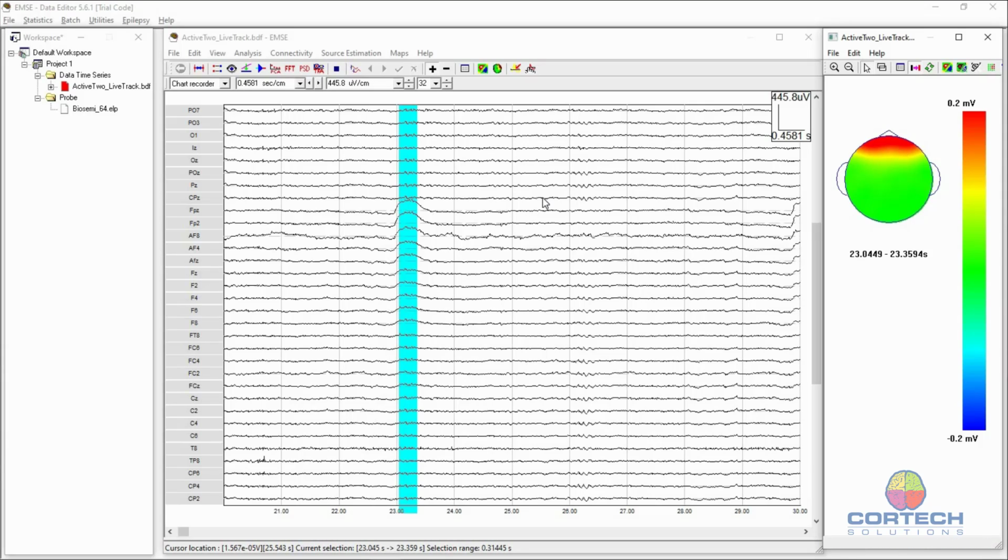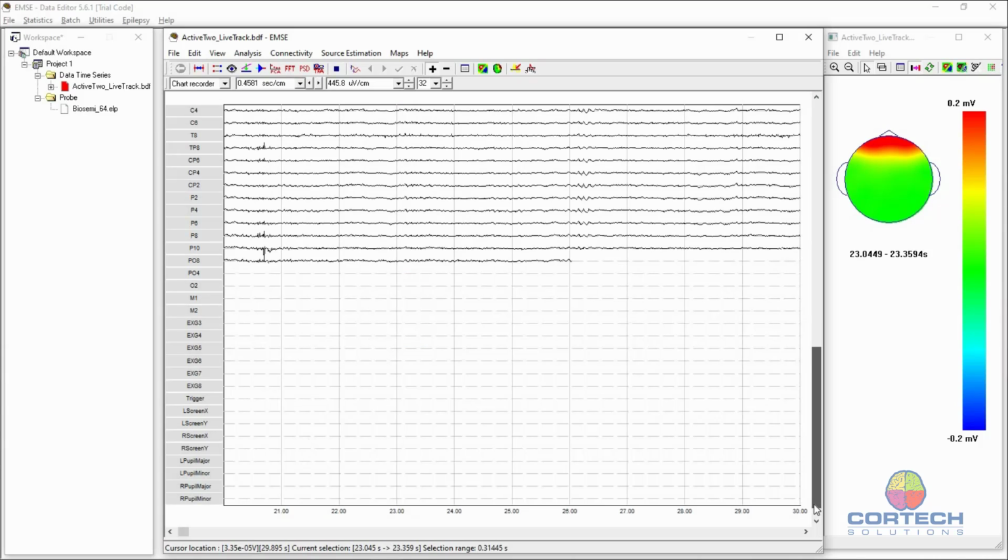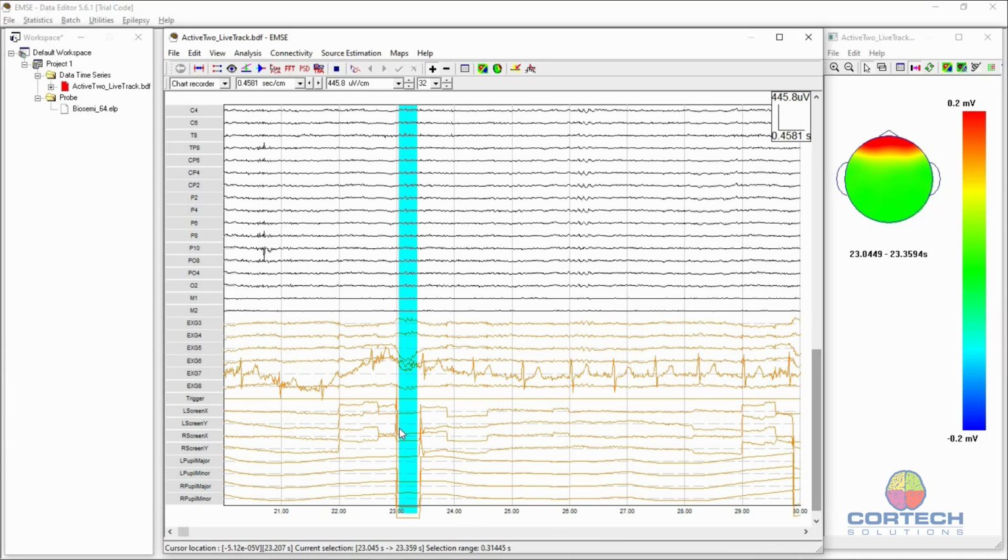Okay, so we already went over this in detail in the other video in the scripting mode version to show that the events are indeed aligned, but this is a quick way to show that when the live track is not tracking the eyes during an eye blink, indeed there is a blink right there. Okay, we'll stop there.